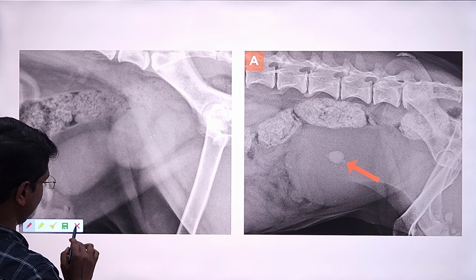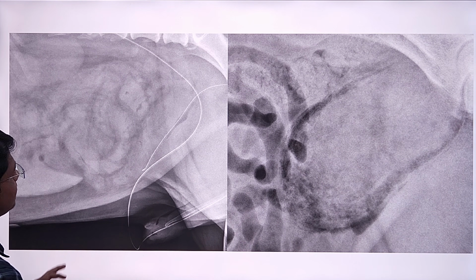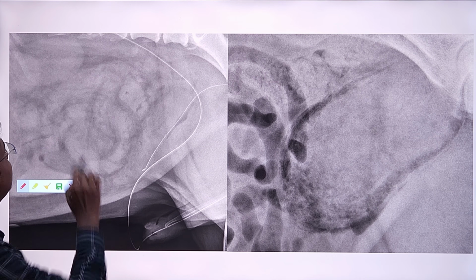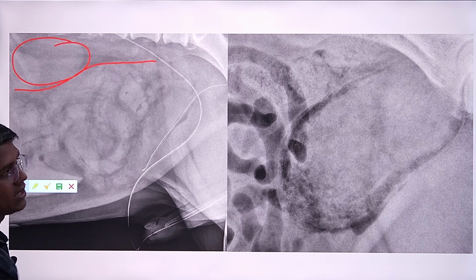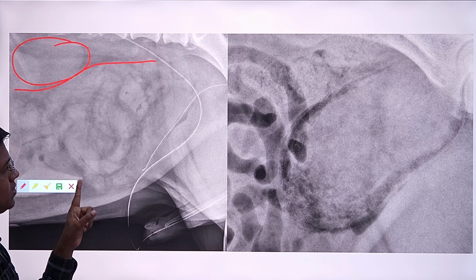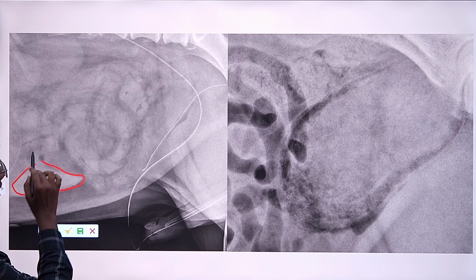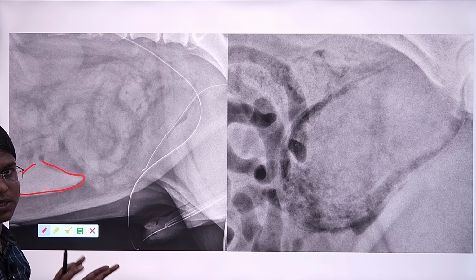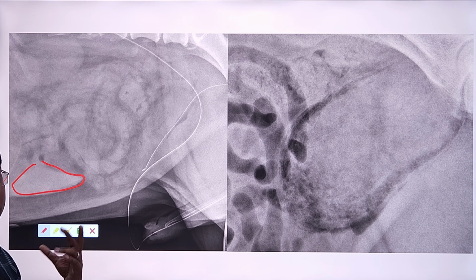normal survey radiographs. Okay, here the bladder is not seen and also the serosal detail is not clear. But remember, the retroperitoneal space is clear. You can find the kidney, a very nice presentation of the kidney. The retroperitoneal space is fine, but the peritoneal space is not clearly visible. Here you can see the spleen slightly clearly, but the border effacement between the intestines is gone. The serosal detail is gone. So this is a case of peritoneal fluid or peritonitis.